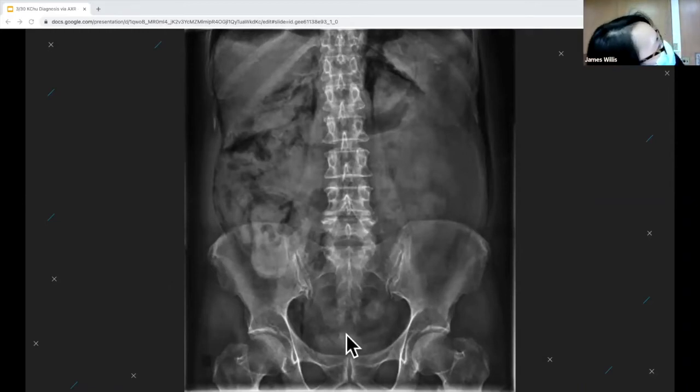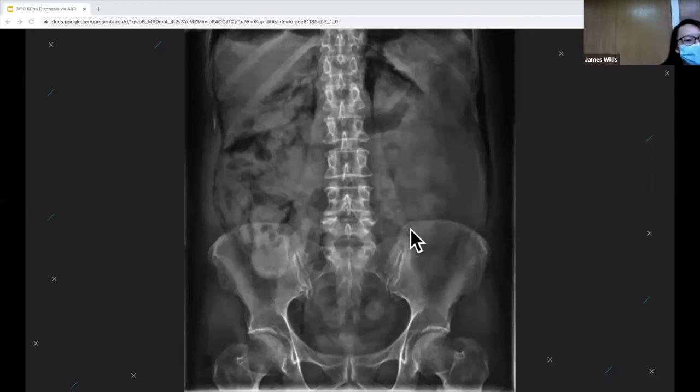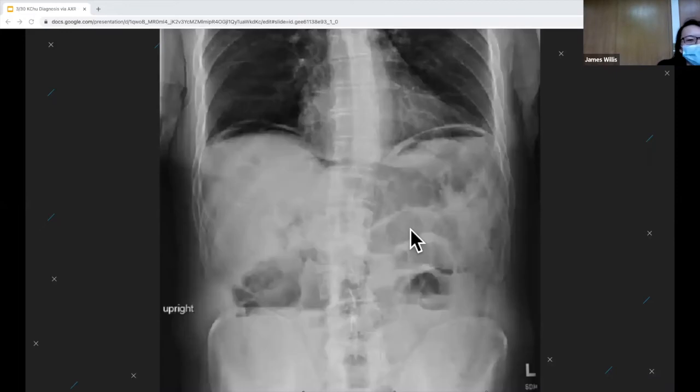Kind of hard. Yeah, it's kind of hard. I might give you this one. But there's pneumoretroperitoneum around here. And it can tell you where the perforation is, like what kind of organs or what parts of the bowel are in the retroperitoneum. Yeah, so ascending or descending colon perforation, or you can have a duodenal perforation as well. For pneumoperitoneum, likely stomach, so gastric, transverse colon, or small bowel.